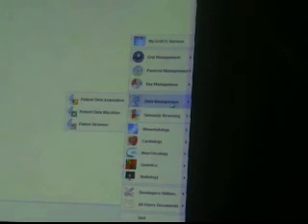What you're interested in is data management, for instance, where you can do patient browsing. So basically, you can browse the content of the system. So this is because the fourth step of the former application was not completed, so it's not a big problem.